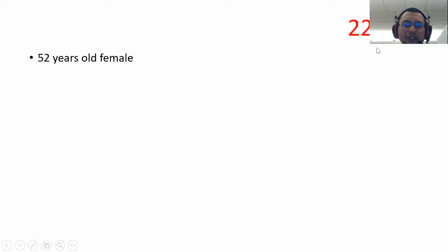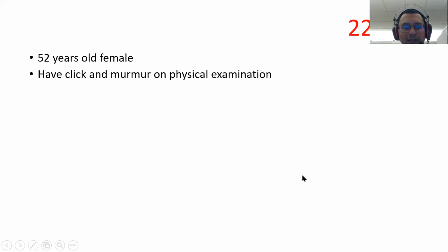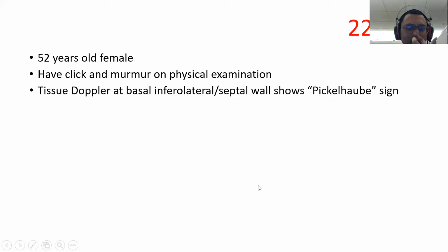So question number 22, this is a 52 years old female, who has a click and murmur on physical examination. So what is your diagnosis? Mitral valve prolapse, correct. Okay. Now, have you ever heard of Pickelhaube sign? Pickelhaube sign. The crown. So basically Pickelhaube sign is the German army's helmet, right?